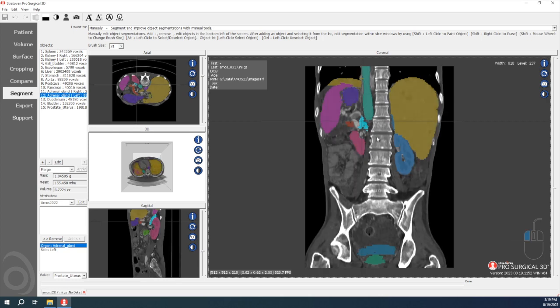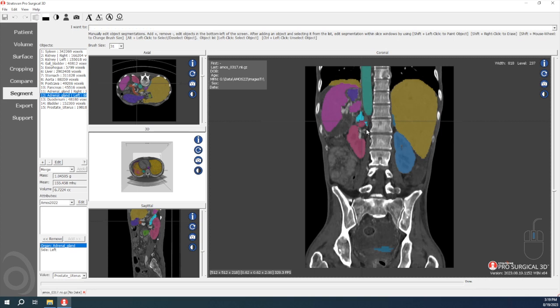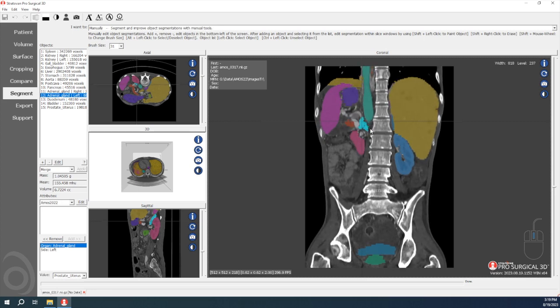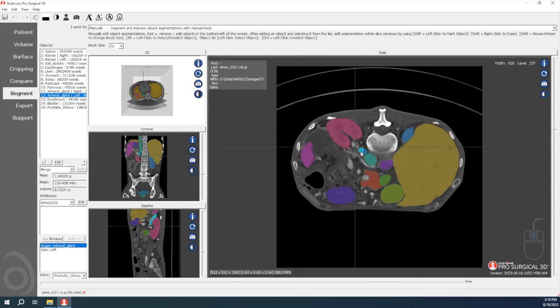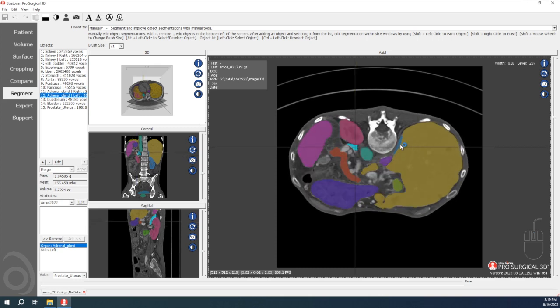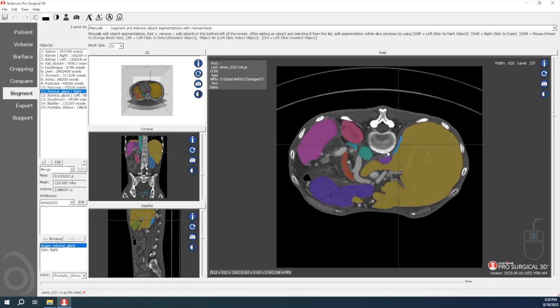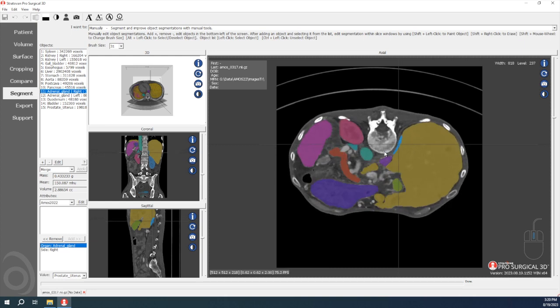And this is indicating that the size and mean value of that is perhaps an outlier. I don't see anything obvious wrong with it. Again, you would need to have an expert review that to see if that's actually an outlier. If you're comparing to the right adrenal gland, that right side does look significantly different from the left. So there perhaps could be an issue there.